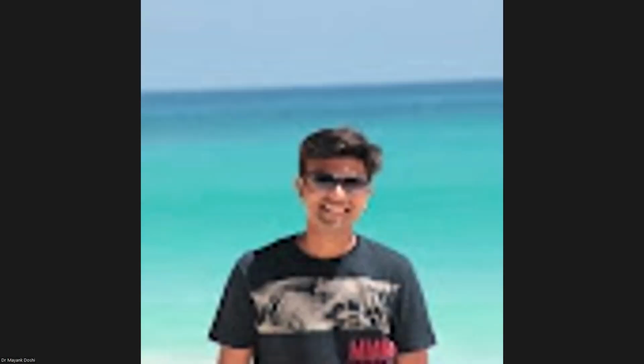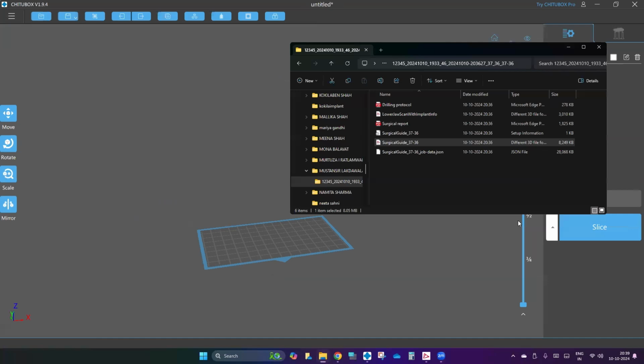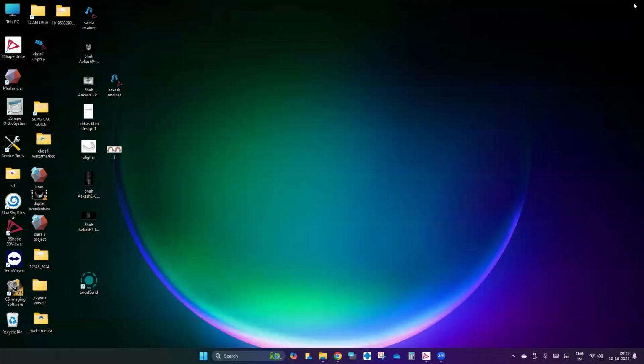What happened? Okay. Everyone saw, right? Yes, it was visible. Okay. So after this, I have my aligner case for which I am going to set my models vertically.